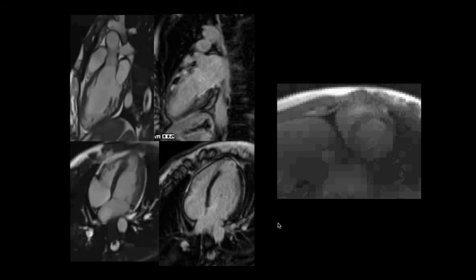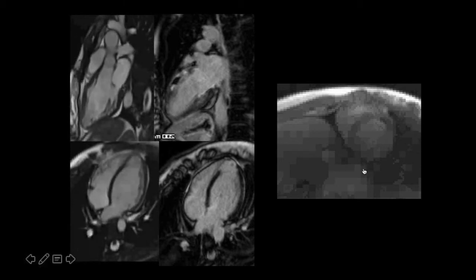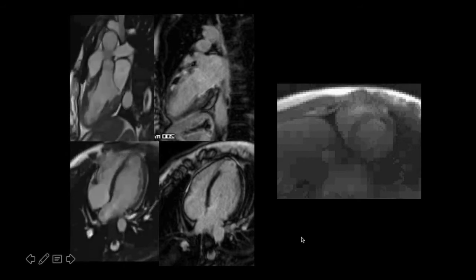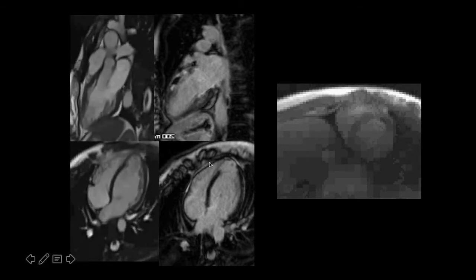So definitely this is an ischemic pattern. There's decreased perfusion, and then there's an ischemic pattern of enhancement. So very useful in this patient, where the differential was myocarditis, I guess Takotsubo, but she's pretty young. So we have an ischemic event here.